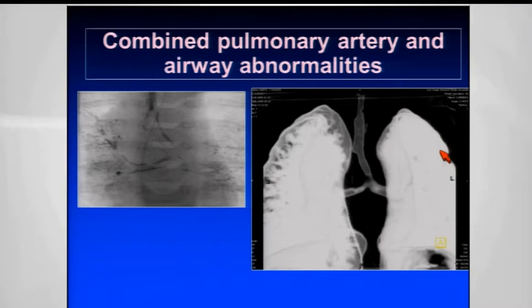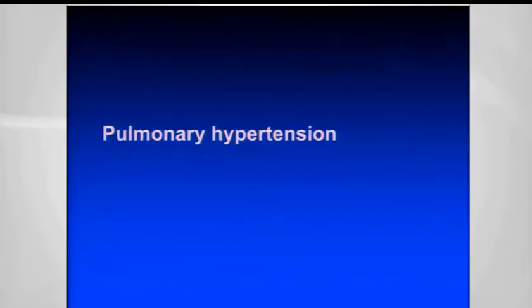And this was associated with the pulmonary sling. The prognosis for this child is much worse with associated abnormal tracheal anatomy than it is with pulmonary sling alone. And there is a significant link between the two. It's absolutely vital the surgeon knows this before he goes in to operate, because correcting the pulmonary sling will not help this trachea, which is really compromised.